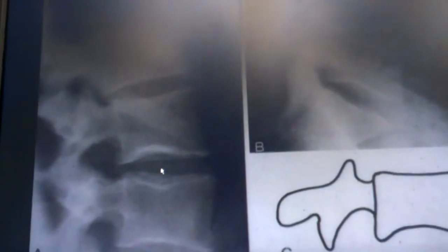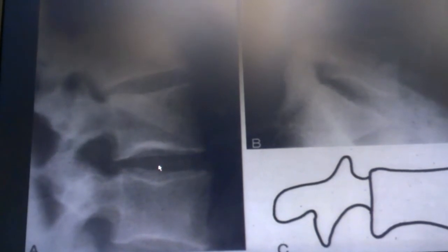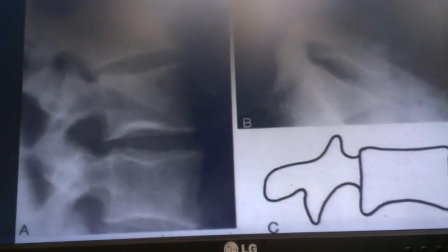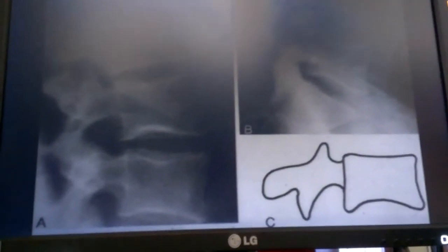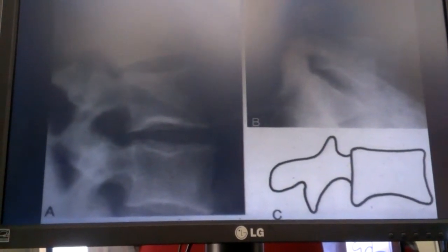And everybody has these. So a few people have put nuclear impression. I mean, if I were to give you this slide, I think you would say nuclear impression because there's really no other normal variant. But some people have been giving you nuclear impression if, you know, there's something like the transitional lumbosacral segment, and they're not giving me the transitional lumbosacral segment. So I didn't give them the point because that's the biggie, not this. So it's all about what's clinically significant, and I would expect that you would agree with me that the transitional lumbosacral segment has more of an impact clinically than this. This means nothing for the most part.